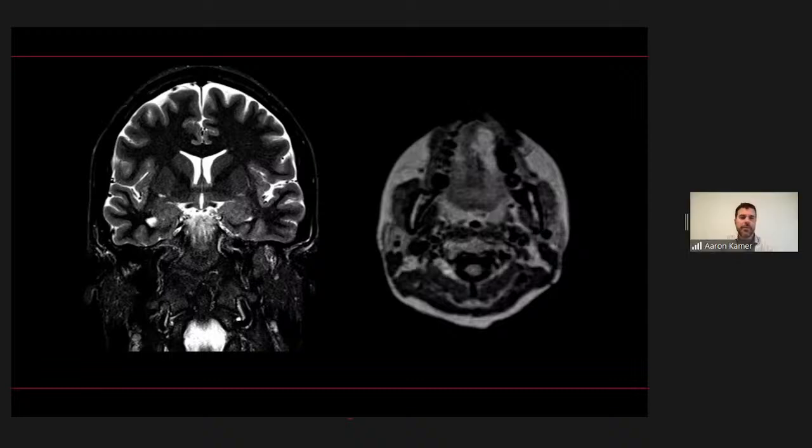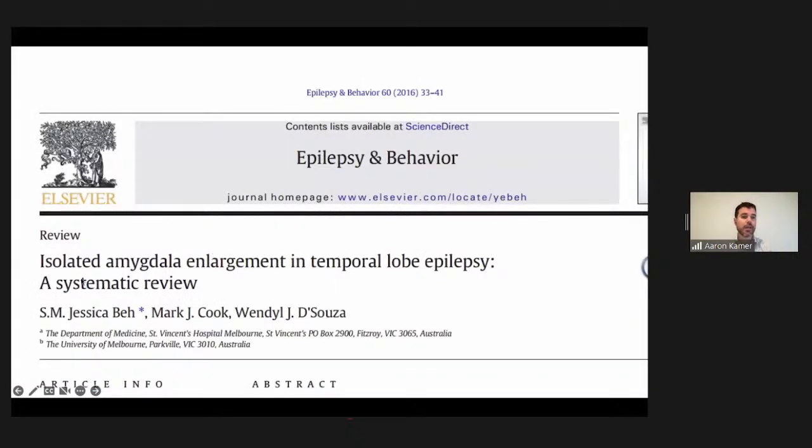It is. Okay. Every once in a while, I show a duplicate or sister case. Okay. So maybe there's some amygdala enlargement, but I don't know if one's more asymmetrically enlarged than the other. If you had to give a side, which would you pick? I'm leaning more towards the left side being larger. Yeah, I totally agree. That looks a little larger to me too. Absolutely.